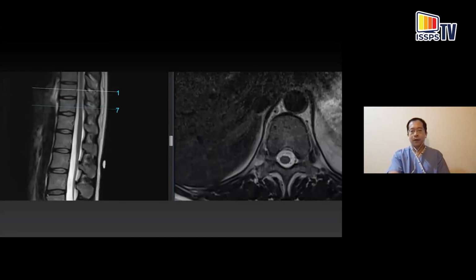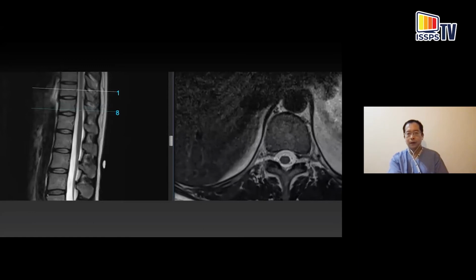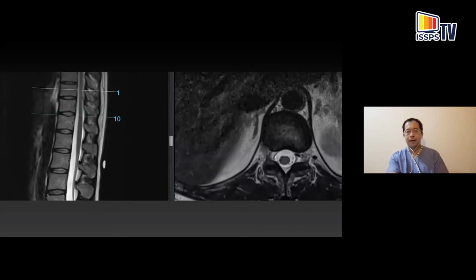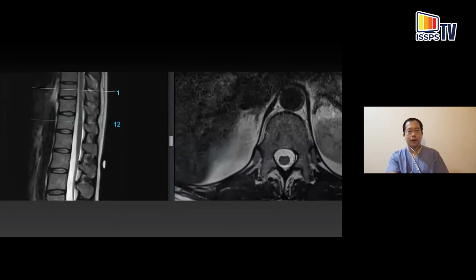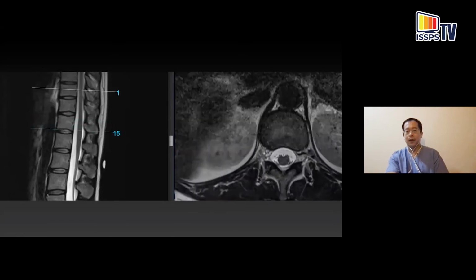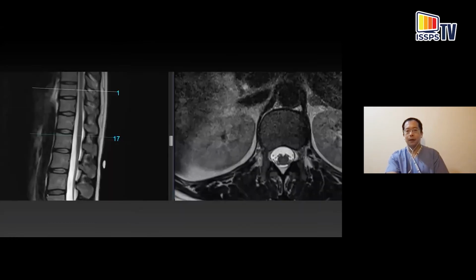And as you go downwards, that very, very short transverse process, they used to be somewhere more lateral, but now they're really medial. So be careful about scanning too lateral because you will then fall off your landmarks in the lower part of the thoracic spine. Down here, just inferior to the transverse process, the facet joint starts to take appearance already. And again, down here, coming down to T11, T12 level, just very, very short transverse processes. And with that, they start to resemble the lumbar spine.